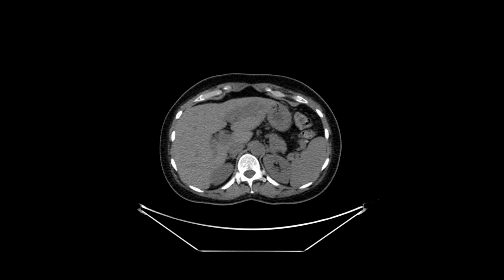On the nuclear medicine portion of this examination, they did not note any significant radiotracer uptake, but on the CT exam, they noted some hypodensity in the left hepatic lobe, and they queried a possible lesion that needed further evaluation.